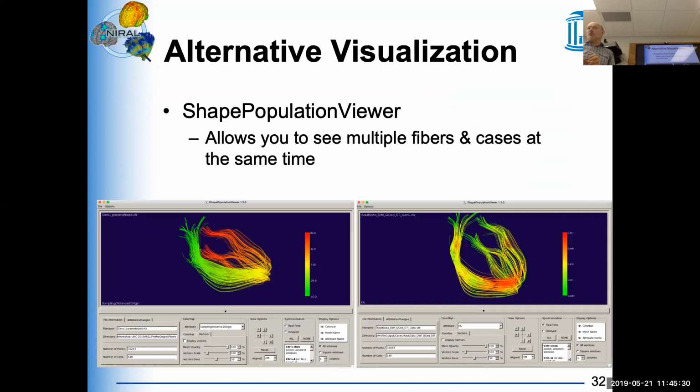We usually do not do that, but if you are the curious kind, you can definitely do so. It's definitely not needed for the purpose of quality control. Now, if you realize that you have a bad profile at one place, that's maybe where you want to go and look at that case's FA and see whether it looks as expected.